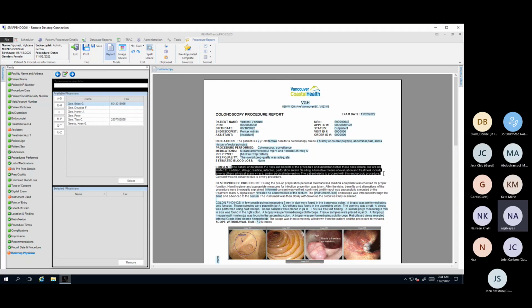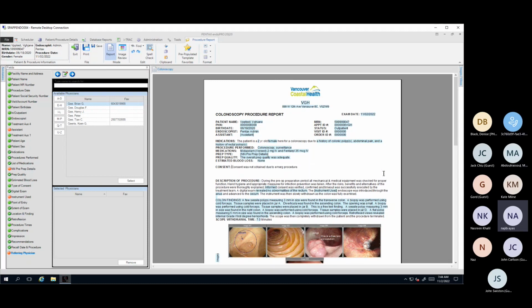Yes. And same thing with that thing that came up with the sex as well. Technically, you can just erase that part and put in what you want, right? Where you say the patient is a 2-year-old female, if you wanted to say patient is a 2-year-old binary, identifies as female, biological male or whatever, you could put that in as free text, right?